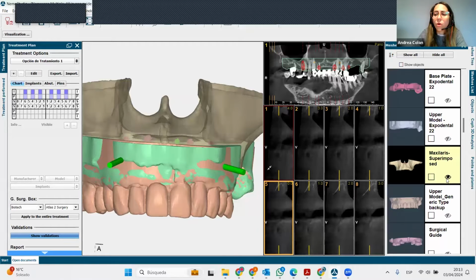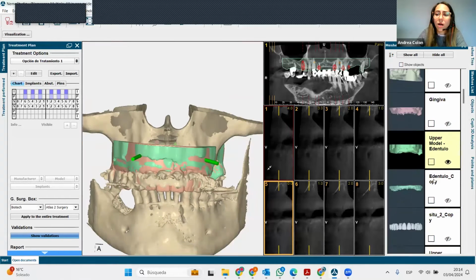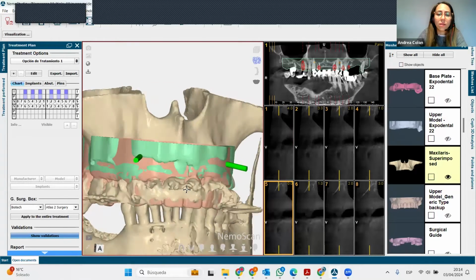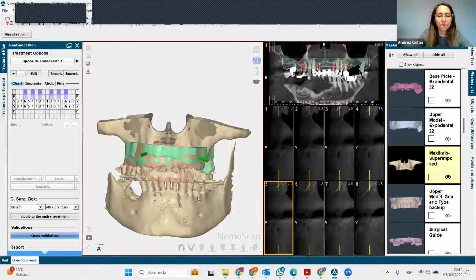For example, this is the original bone, and then you can have a result like this one with that feature. So all the preparation part, you can skip. I'm going to show you how it would look, also how to segment maxilla and mandible. All of this will be automatic.